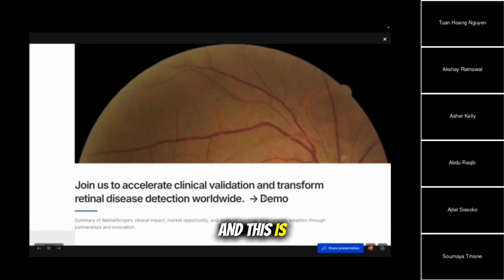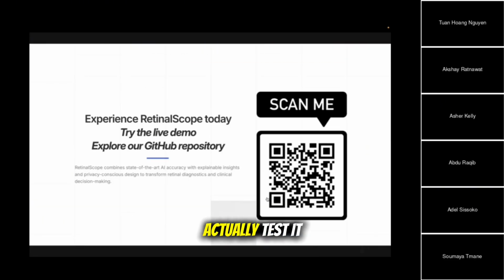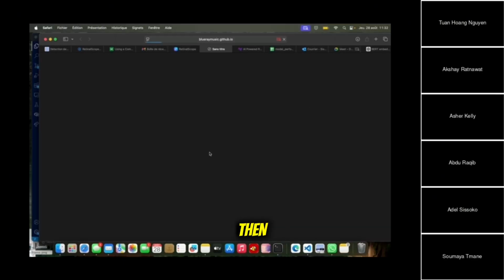And if you have your smartphone with you, you can scan this QR code in order to actually test it with me, which would be very cool. You can just scan this one. Or for the purpose of this presentation, let me just do it live.